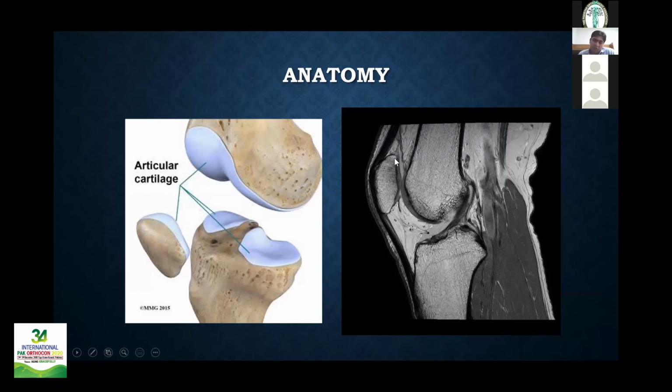On the patella it appears as a spindle-shaped elongated structure, which is relatively wider in its lower half and then tapers towards the superior and the inferior poles. It is relatively iso-intense, and it should be homogeneous without any abnormal signals.